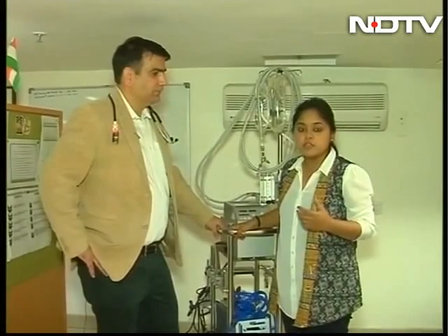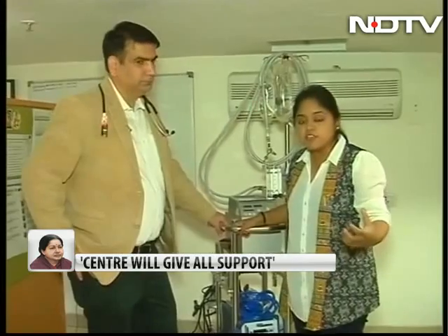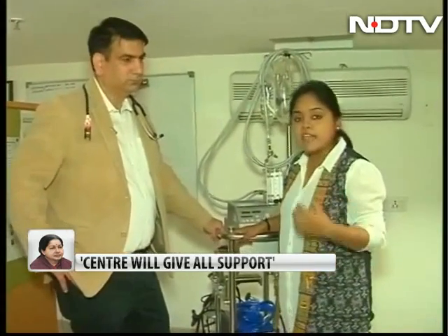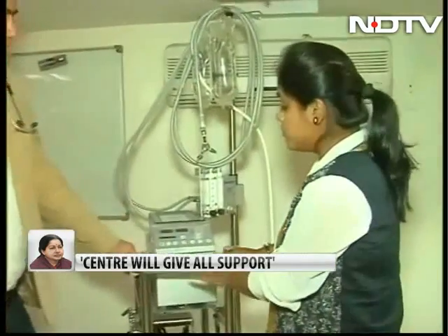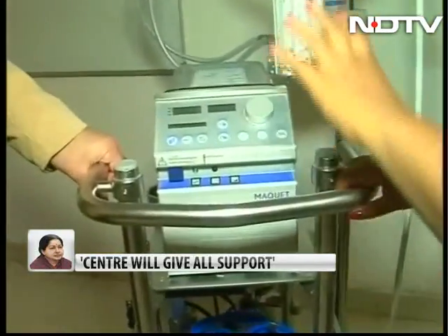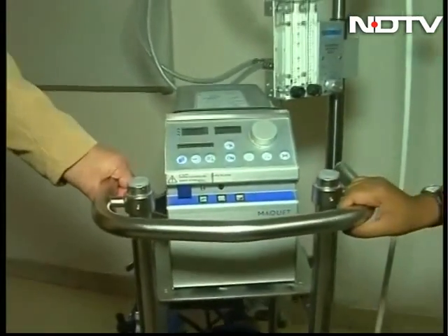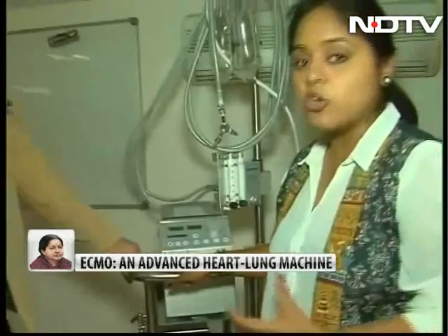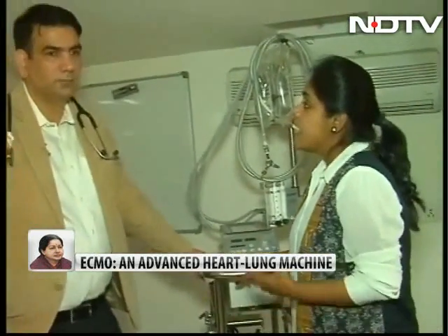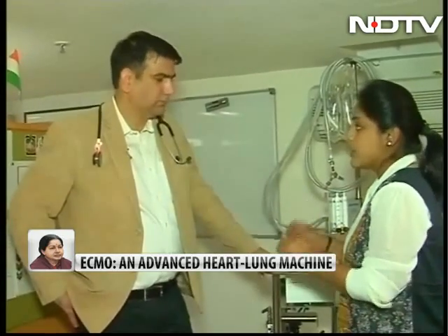When a patient suffers a cardiac arrest, he needs an alternative method to pump blood, and that is exactly what an ECMO machine does. This is an ECMO machine here, and this entire machine acts as an alternative method of pumping blood. I'm now joined by Dr. Raj Kumar, who's a specialist in ECMO. Dr. Kumar, can you please explain to us what ECMO is and what it does?